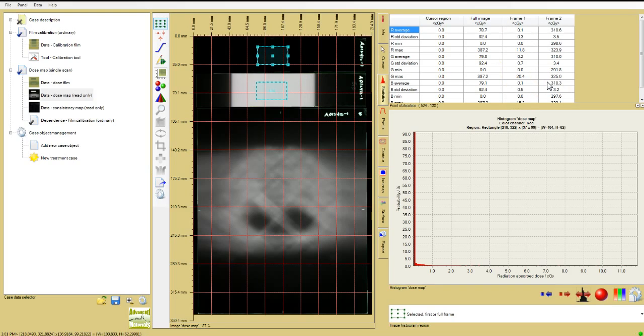exposure. The difference could be due to scan-to-scan variability of the scanner, or the temperature difference between the times the calibration films and dose film were scanned. In any event, if you stop here, you've just accepted a 1% offset in your measurements.